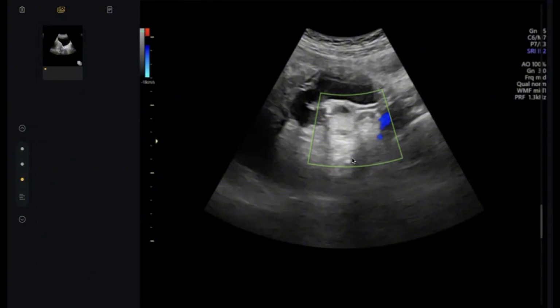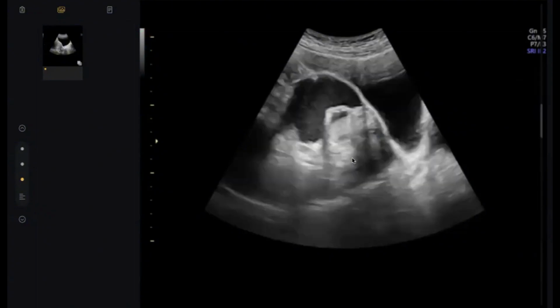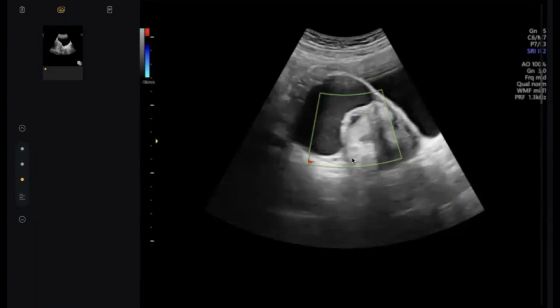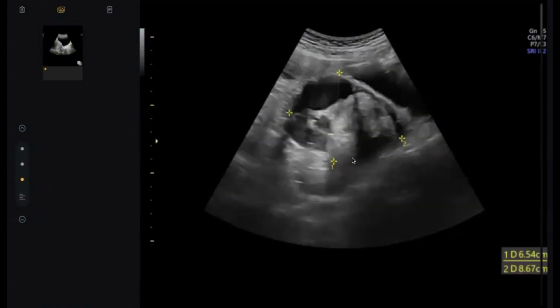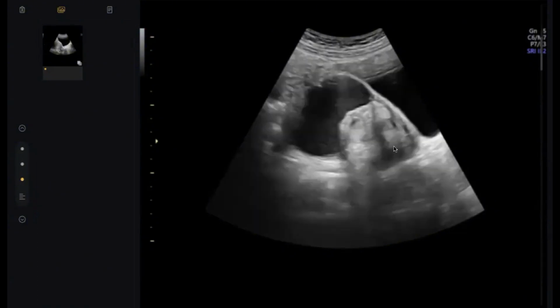What's your diagnosis? Dermoid. But low-level internal echoes in a dermoid cyst? This buzzword is about hemorrhage. Sir, I wanted to tell you low-level internal echoes in the cystic part, I wanted to tell there are hair or echogenic parts. What is seen in dermoid? See, and the solid part, I wanted to say it's fat. This is the echogenic part and the solid part. Actually, here there are no obvious low-level internal echoes.